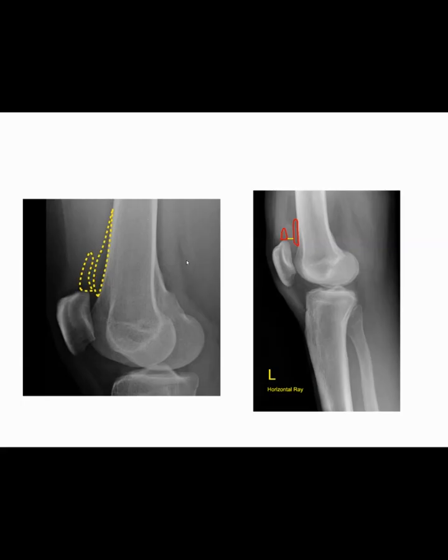for the radiograph itself. Typically for a lateral knee radiograph, the lateral aspect of the knee will be against the imaging detector. So consequently that means that the medial femoral condyle will be farther away. And due to the divergent path of an X-ray beam, this medial condyle will now be magnified, and its distal articular surface will be projected inferiorly.